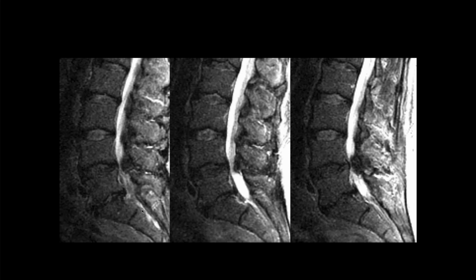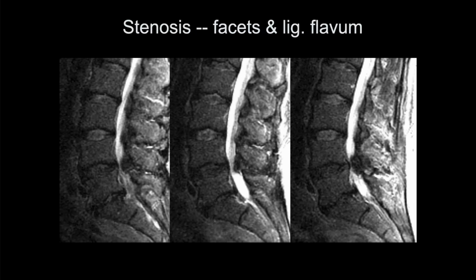Okay, Dan. Like on the STIR images, it looks like there could be some ligamentum flavum hypertrophy causing severe stenosis. Right. And then a lot of people say hypertrophy of the ligamentum flavum.